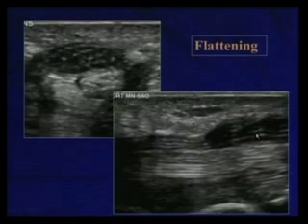Look at this sagittal view: you can see very well the pre-stenosis dilation of the nerve. This is the FDP, FDS, this is the median nerve, and the carpal ligament is located at this level, and that's why you see this swelling of the nerve proximally. So we go there and we measure the cross-sectional area.